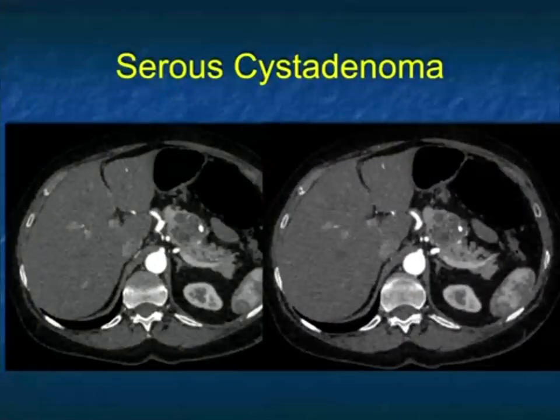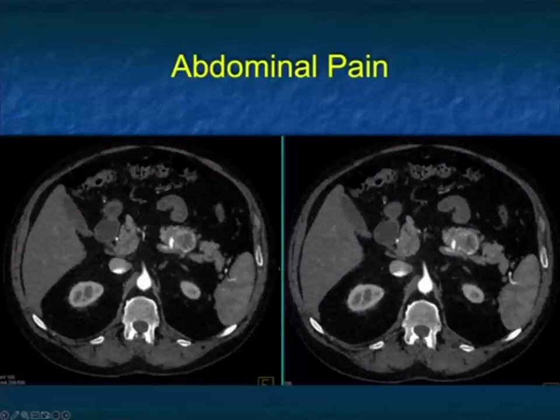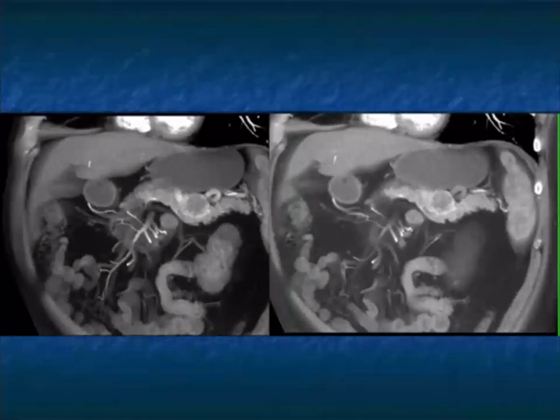Again, a great chameleon. Another case, cystic lesion, but an enhancing rim. When I look at this case without thinking, I say this is a neuroendocrine tumor. Neuroendocrine tumors are typically vascular, but they can be somewhat cystic with rim-like enhancement. 2 centimeters, that's a good size. The smaller the lesion, the more likely it will be followed, because these lesions can be grade 1, where the following will be adequate. 2 cm is kind of the borderline what people think.